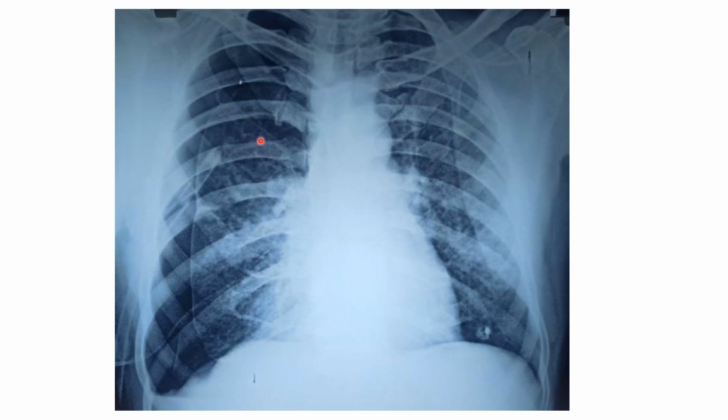In this X-ray, see the periphery. So here it is hyperlucent. Here you don't see any bronchovascular markings, and this is the partially collapsed lung. I hope you can make this out. This is the partially collapsed lung, this margin. This is also called as the pleural line. So pleural line is visible. So hyperlucency and absence of bronchovascular markings, pleural line indicating partially collapsed lung.